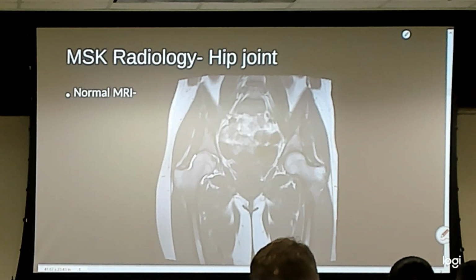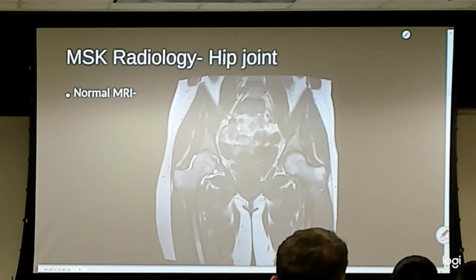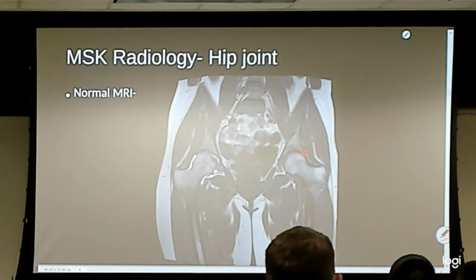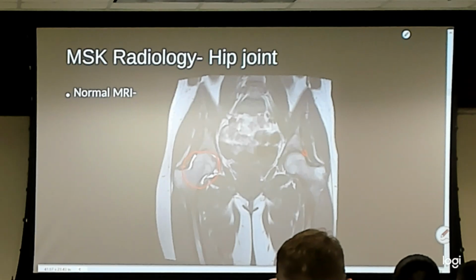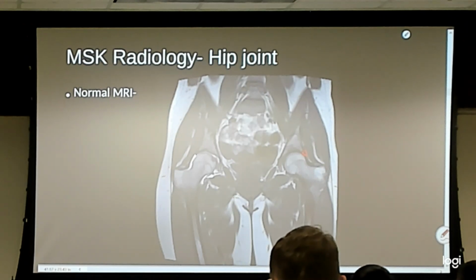Switching over to MRI. We like the hip MRIs. We used them a couple times yesterday when we were looking at blood supply, when we were looking at the density of the bone. We need them to assess the labrum. When we look at the labrum, this is a non-contrasted study, so you're gonna have, actually it's contrasted on this side. So maybe this person has a problem on this side. We're looking at the labrum superiorly. If we get a different cut, then we could see it elsewhere. It's not as good on the inferior border in this, but you can get some information.